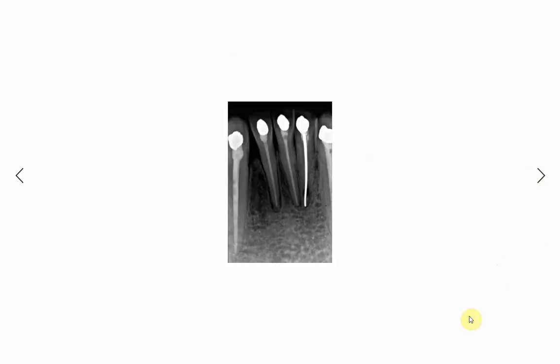In this radiograph of the lower central incisors and the canine, see how long the canine is appearing. Here the same problem has been encountered, that is when the beam is directed perpendicular on the sensor, not on the bisector. In other words, reduction in the vertical angulation. So a reduced vertical angulation will definitely lead to elongation of the images.